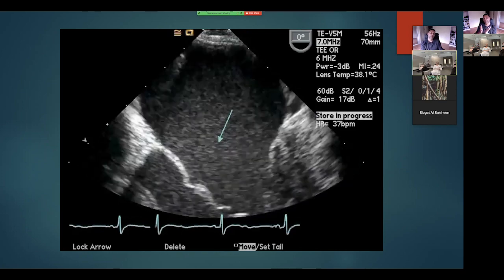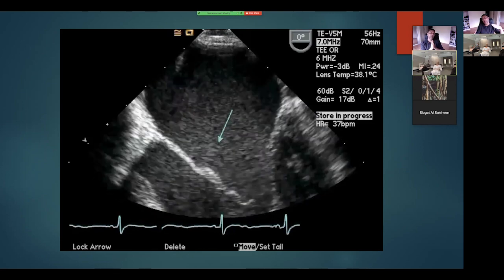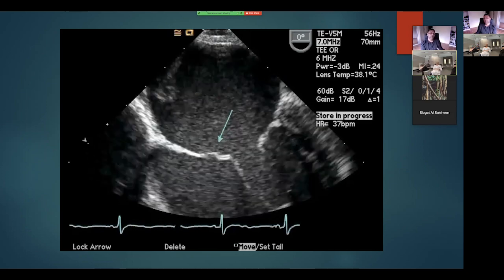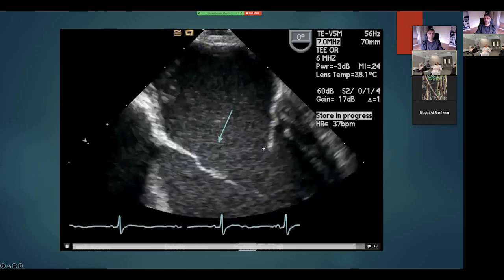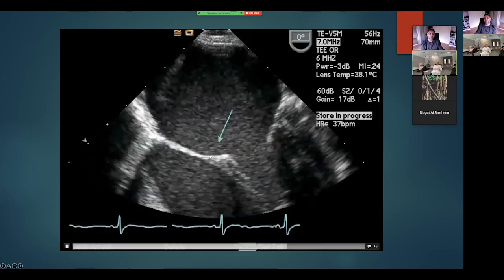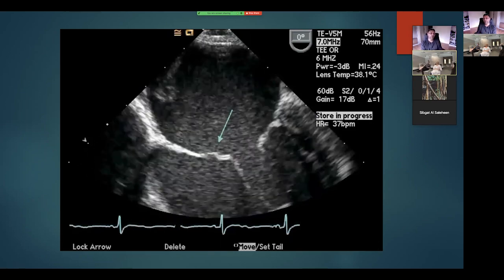No. In the esophageal 4-chamber, if you remember, we are cutting at 0 degrees or 180 degrees, and we are going through A2 to P2, and this is the same as the parasternal long axis. So you're correct, this is anterior and this is posterior, but we're cutting at the center, so that's why it should be A2. In the 4-chamber, we only see the A2 and P2 scallops.